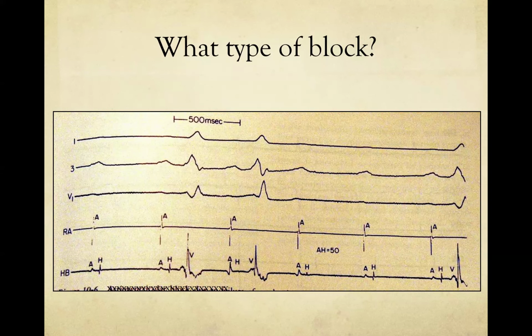when he retired, he left me a whole bunch. Dr. Krongrad had written a lot of papers on basics of EP, because he used to do EP studies in the era before ablation, and he just left me a whole bunch of books that he didn't want to carry home, and there were some old EP tracings, so I remember I took some pictures of them. So they're telling us the AH interval is 50. So what do you think is going on here? Anybody have any thoughts?